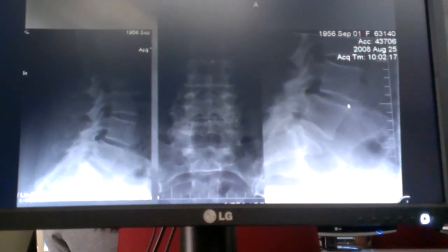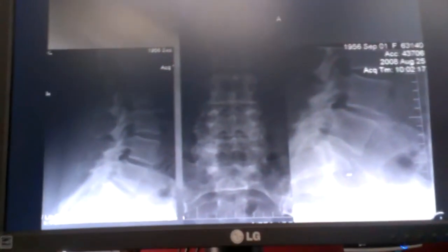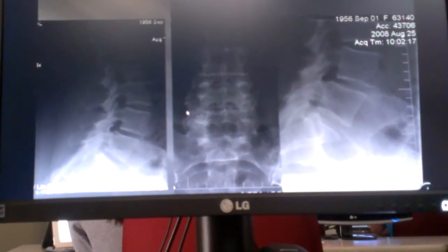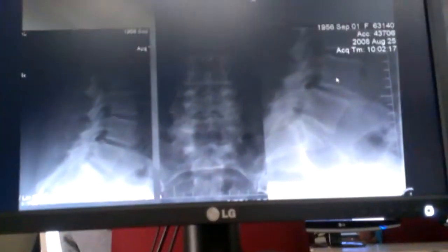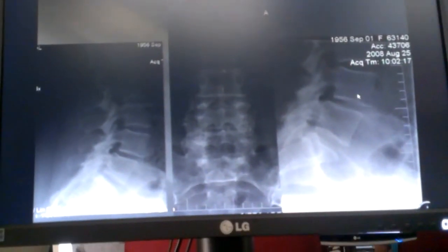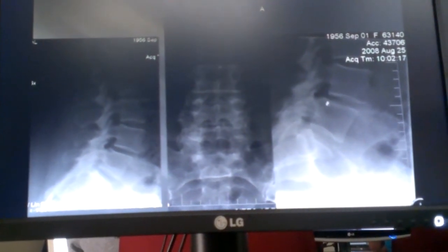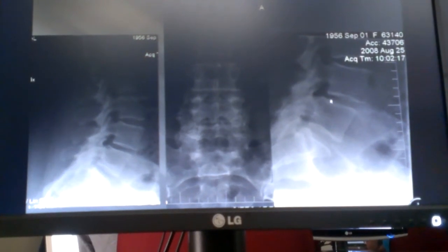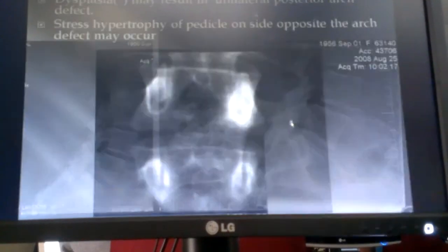Just like with L5, sometimes you can get buttressing calcium here, it's called, right? To try and hold that vertebra back. But you can see the degenerative changes, and you can see how they're extending laterally here, and that would be referred to as degenerative. Now, the thing is, again, this is not going to go more, in the lifetime of that individual, than a grade 1, right? So usually they don't go beyond 25% of the distance along the superior plate of the vertebra below.